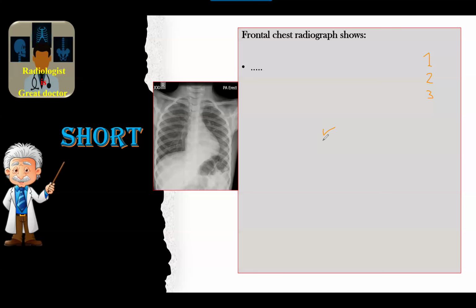There is no other finding. Normal cardiac size and normal bones. Diagnosis: it's an infective etiology in a child of this age, likely consolidation. My differential may include sequestration, but I will request cross-sectional imaging if the patient has not improved after an empirical trial.